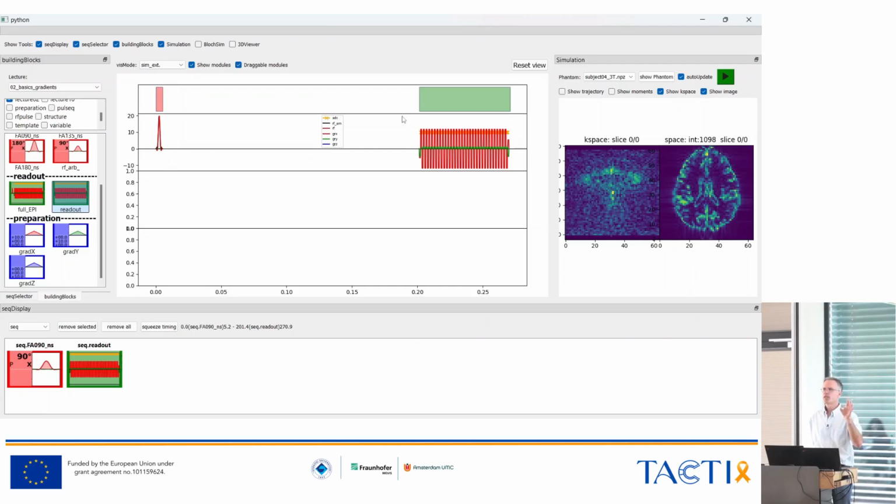So we call it B0 inhomogeneities. That one is also simulating more or less realistic changes in magnetic field you will experience in brain images, and especially in the frontal part where you have this interface between air of the sinuses and tissue of the brain.